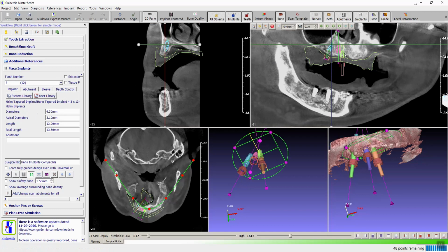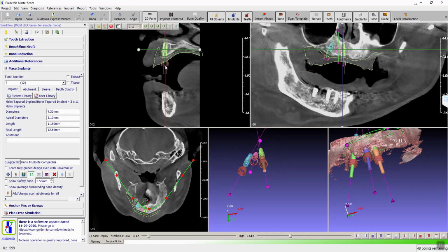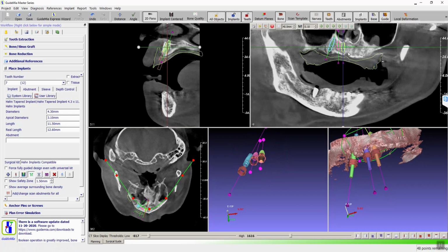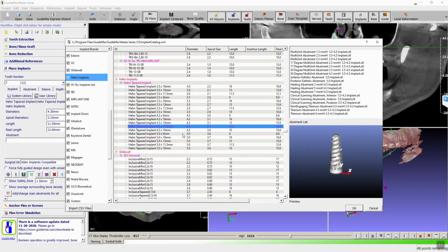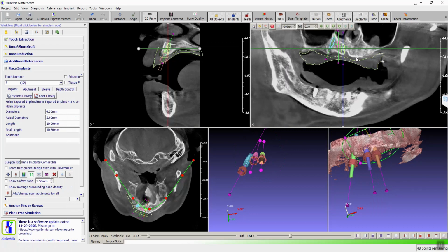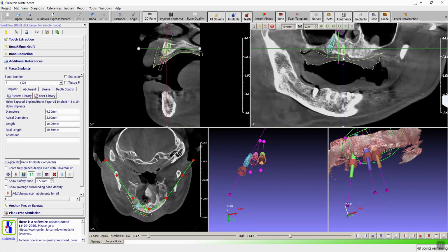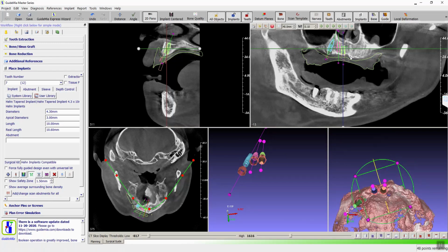That plus sign will reuse the same implant length and diameter you used last time? Yes. So is that too long? I think we don't have space. Yeah. He'll whistle when he breathes through his nose. Yeah. All right. So let's say we change it to 10. Still getting into the nose, and there's not much space here. Maybe we should move 5, right? Move 5 a little bit over.